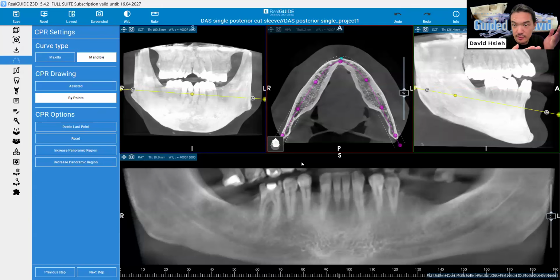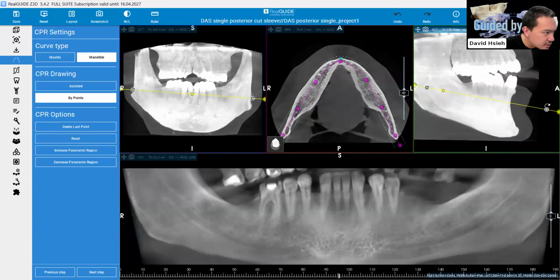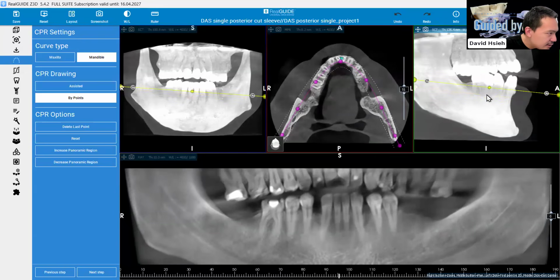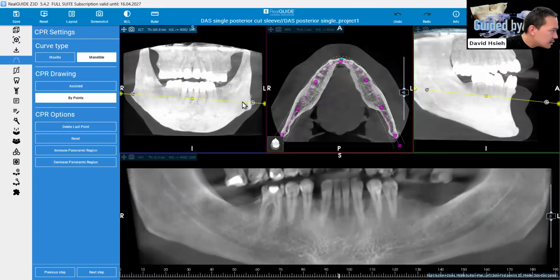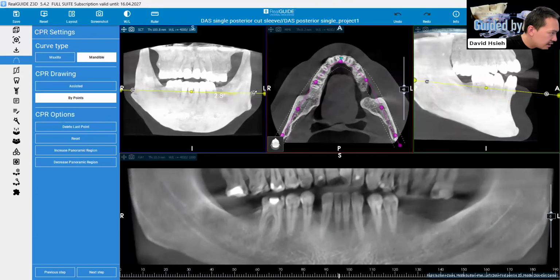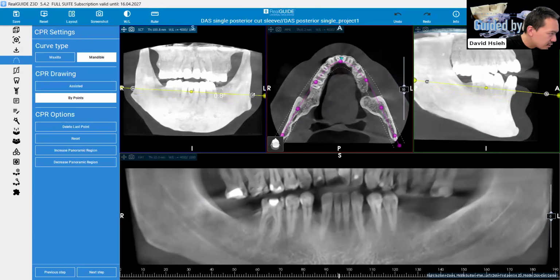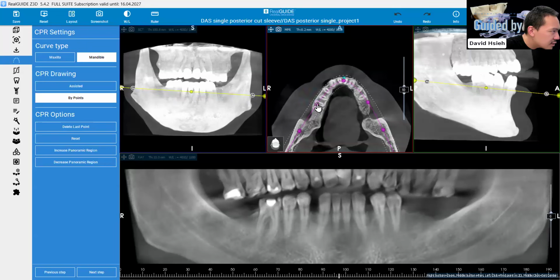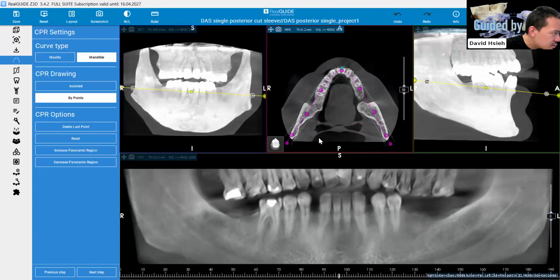All right. See, so the software just basically did its job, right? So what we need to do is to check the occlusal plane. If you're not happy with that, we can still adjust it a little bit. You can see the right or left, just try to make it as parallel to the jaw as possible. And then if you want to do some fine tweaking, you want the nerve canal to show more accurately, you can still tweak the position of it.